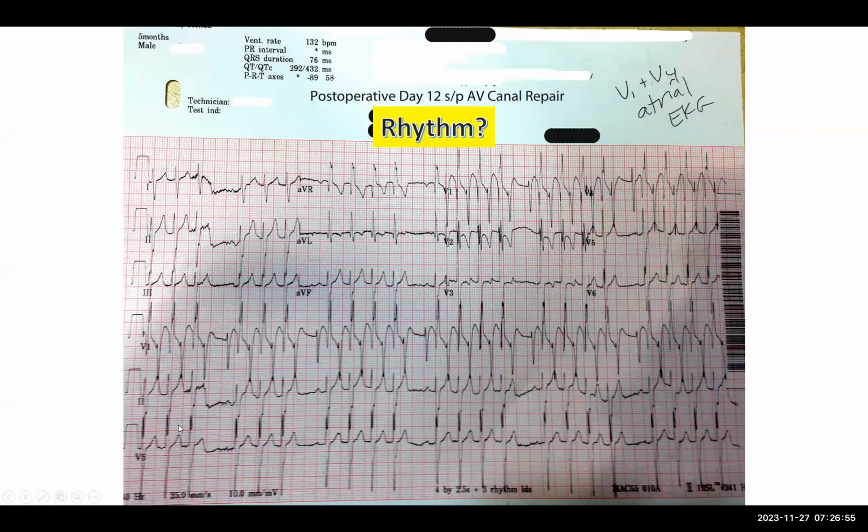So even if you didn't have the entire top of this tracing, all you had was leads 2 and V5, and I saw a couple of beats, some block, a couple of beats, some block. Now, just looking at these tracings, it's very hard to know that there's a P wave in that T wave, right? You could just think these are somewhat peaked T waves. You do see a P wave here, but it's hard to know what the T wave looks like without the P wave on top of it, because we don't ever have a T wave that doesn't have a P wave on it.